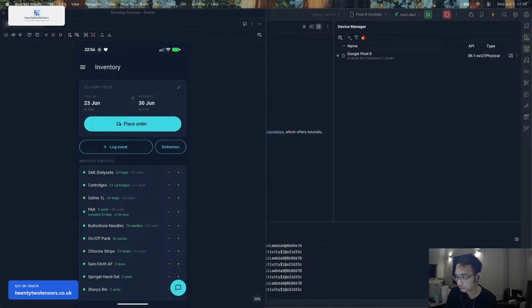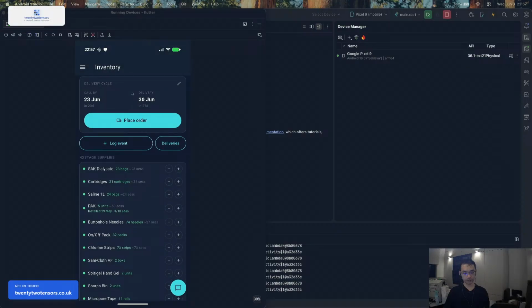I usually have a problem with the pack, so I add the pack's changing date to track it. One pack can be used for a number of transactions, and I can also have a list of previous deliveries here.